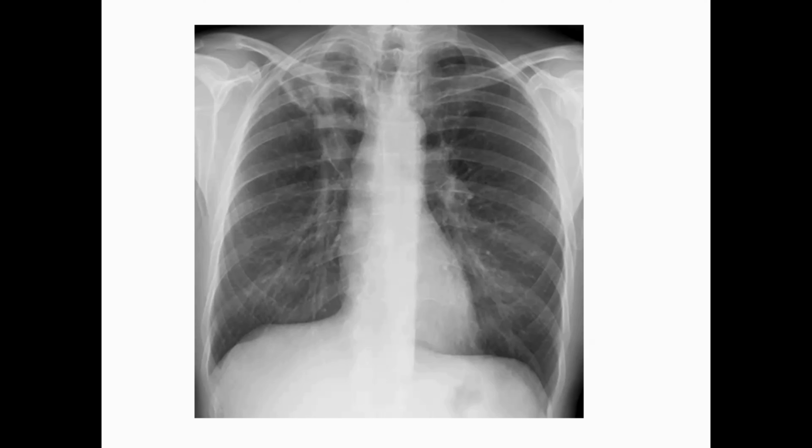First, usually secondary TB occurs in the apical zone, and it's heterogeneous, and also cavitation. One of the cardinal features of reactivation TB, I mean activity, is a cavity-like lesion. If you see a small cavity, okay? You are going to advise a sputum test for acid-fast bacilli to exclude TB.